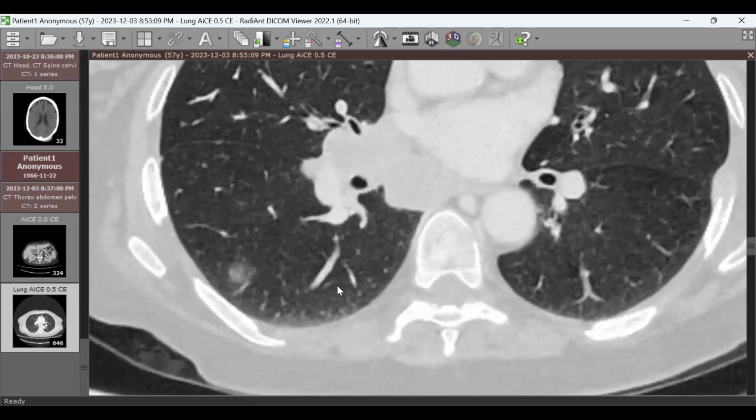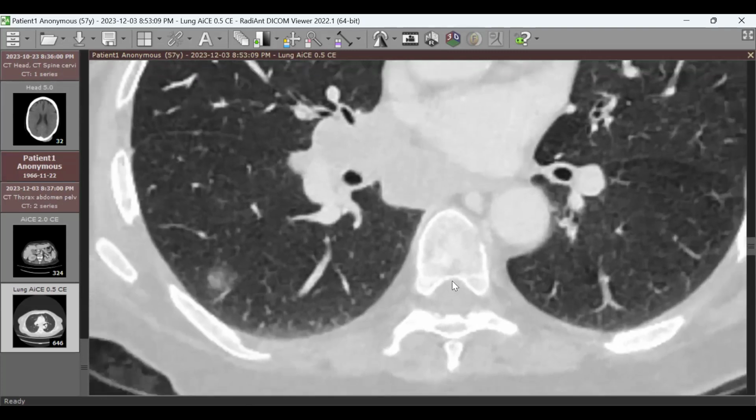So we go back to any previous imaging and compare if it is stable. Because why? Because some of the ground glass nodules are inflammatory, right? And they could disappear within a few weeks. But if they are stable for at least 3 months, or on any previous CT 1 year, 2 years ago, this means this could be a potential adenocarcinoma. And we need to follow that, okay?